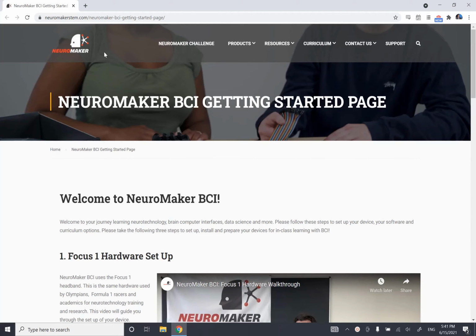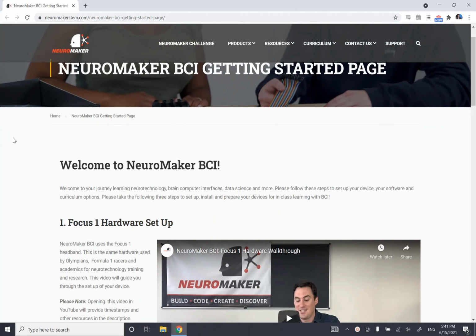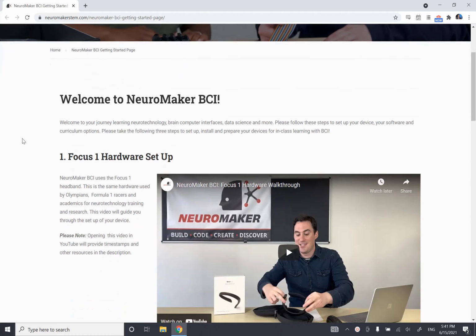Our first step is by navigating to this web page on neuromakerstem.com/neuromaker-bci-getting-started-page. You're going to be able to find all the resources you need to get your NeuroMaker BCI solution up and running. So you've probably already seen these things on the page so far.